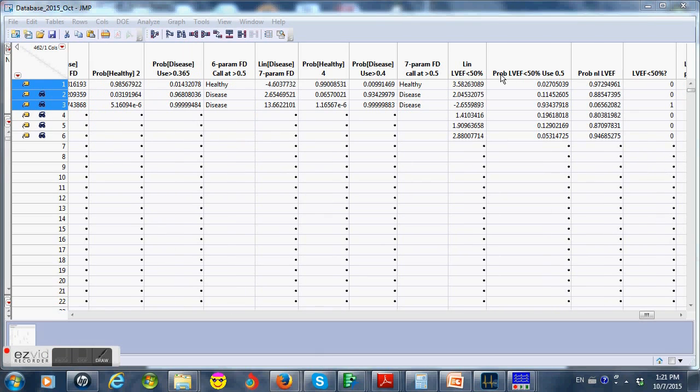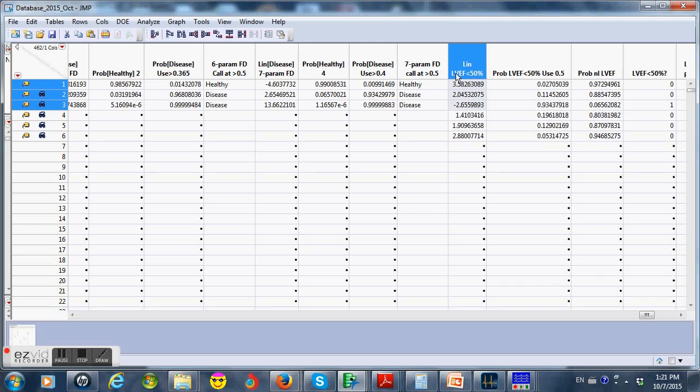We can also do another score. This is for left ventricular systolic dysfunction. So we're looking for the possibility by ECG of a left ventricular ejection fraction less than 50%. This was published as well in 2010 in one of our papers. And we can see here now that in this score, everybody looks like they have an ejection fraction over 50%, except for patient number 3.